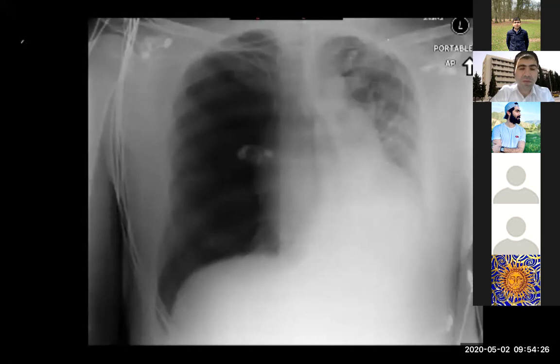So the mediastinum means this side, the right side, right? Yes. So this is right, this is left. Here it is annotated that this is the left, L. Sometimes they put R here, which is right.